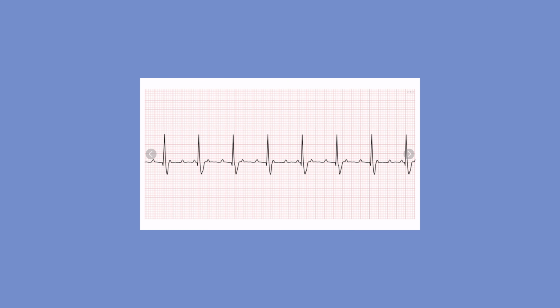Because there's P waves, there's QRS complexes, it could be normal. But the difference is that, as you can see, this PR interval is abnormal, that one's different, that one's different, that one's different, that one's different, and then you've got obviously random P waves in between it as well. So there is no regulation, there's no regularity between the PR of any of them.